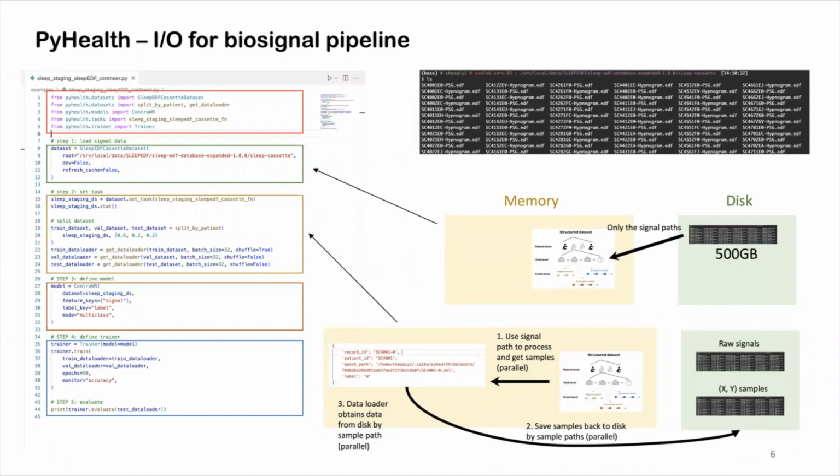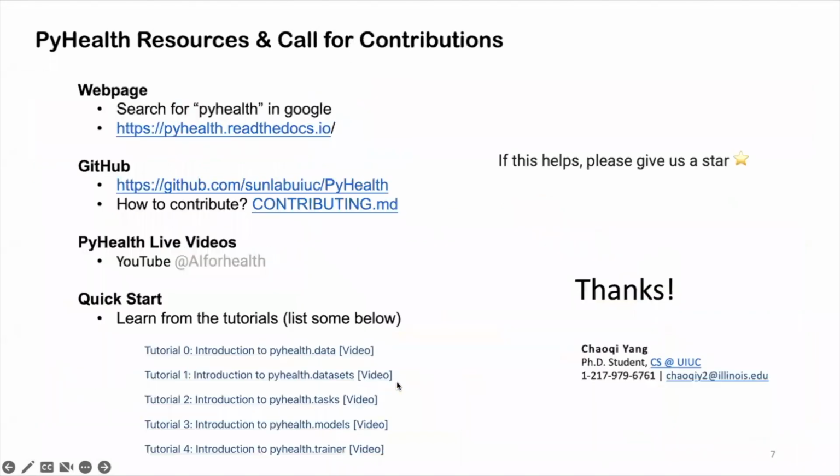Right now, our task treats each 30-second epoch as an independent epoch. We didn't consider their time order information. It may be useful down the road, and it's easy to add back to this JSON.